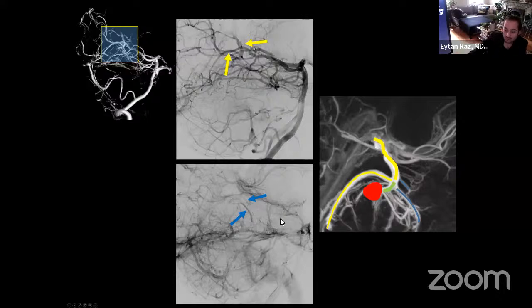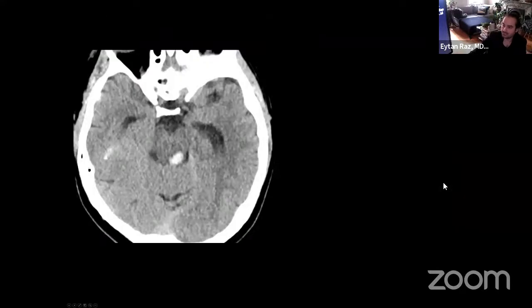So this other vein here, and then there's another vein there, but now we understand that these veins actually are not used by the AVM. These are veins of the normal cerebellum that drain in the same location. So if we decide, okay, let's just do a transvenous embolization from here and close this whole vein, we put in danger part of the cerebellum and the brainstem, because they don't have their outflow anymore. So this is a patient that in our lab went to surgery to do a selective resection of the AVM, closing this vein while preserving these veins.